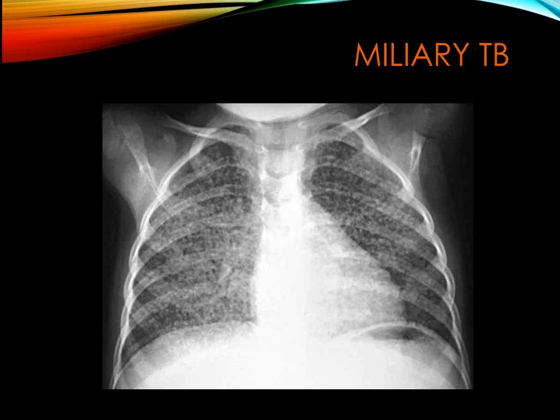non-fused epiphysis. If you notice, the epiphysis of the humerus is not fused, this is a skeletally immature skeleton. So when we consider the differential diagnosis, of course metastasis and pneumoconiosis are unlikely in the pediatric age group. So we are left with the infections, especially TB and chickenpox. By the way, both the primary and the post-primary TB can present with the miliary shadow.